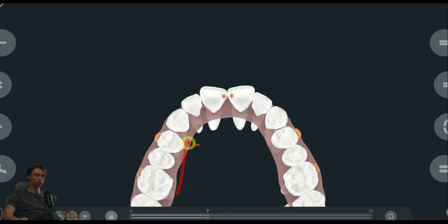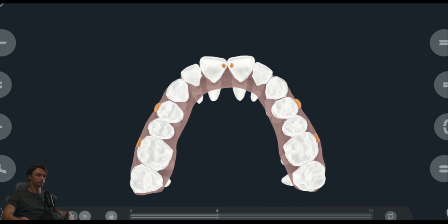Because when we engage the entire surface of the aligner, when we expand the entire geometry of the tray, the effect on the anterior segment is much greater than if we were working on a single tooth. In other words, the tray expands evenly across the entire surface and better pushes the front teeth in the vestibular direction. Let's look at the animation.